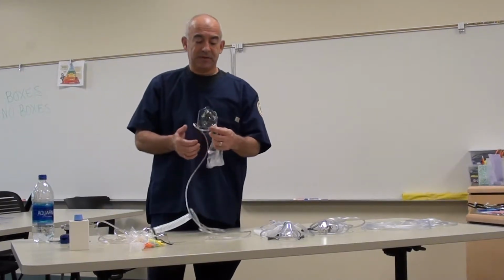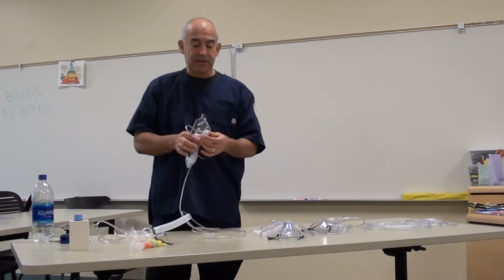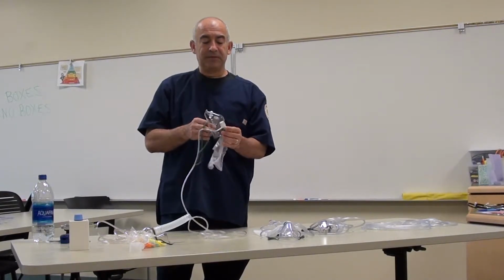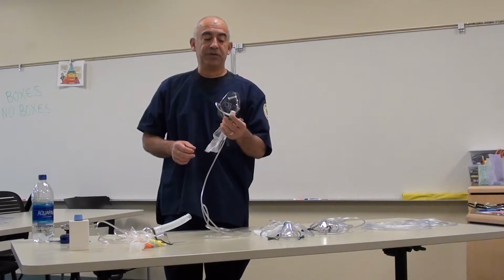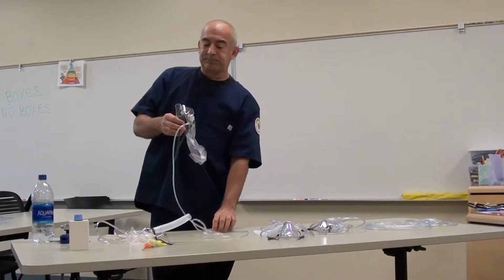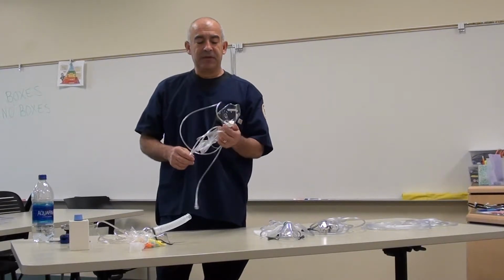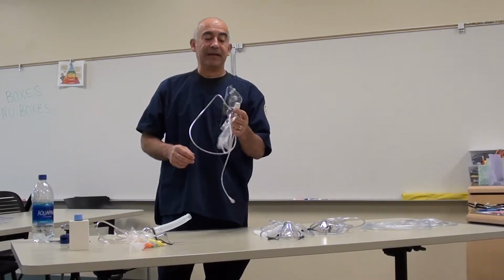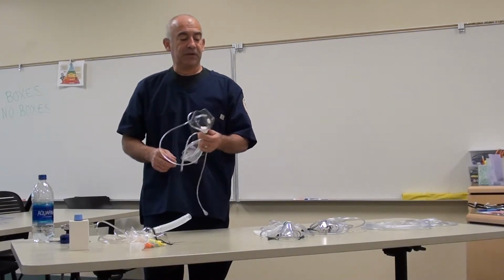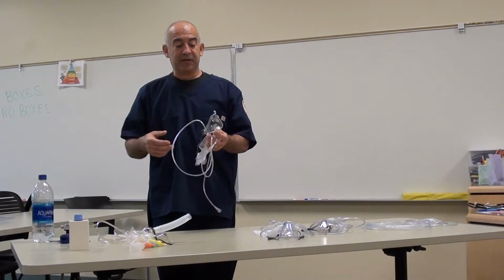The next device I'm going to talk about today is the non-rebreather mask. A non-rebreather mask, similar to the partial rebreather, requires a minimum liter flow of 10 liters per minute, offers an FiO2 of 60 to 80%, and is considered a variable FiO2. This particular mask also has the advantages that it's easy to use and inexpensive, and delivers a nice high flow of FiO2 to the patient. Disadvantages, also similar to the other masks, are a suffocation hazard, you have to take it off to eat, and it can be uncomfortable for some patients.